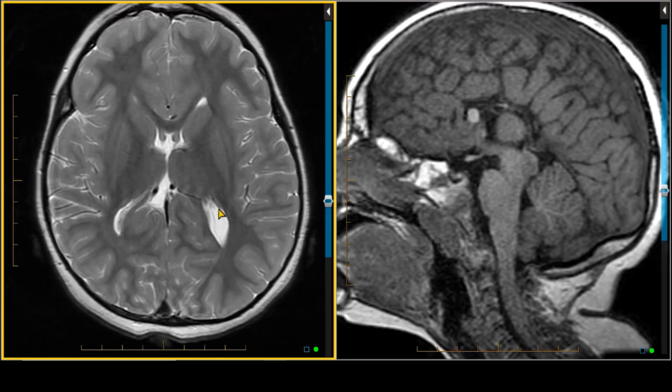Now, this is not a true agenesis of the corpus callosum, because if we look here, we actually see some midline commissural fibers in a portion of the corpus callosum. If we go back to the mid-sagittal image, we see a very, very small area. So this is not complete agenesis, which means complete absence, but this is definitely a very severe dysgenesis, or abnormal development, of the corpus callosum.